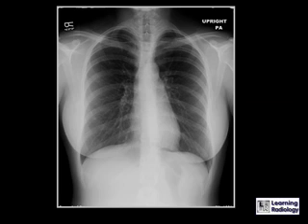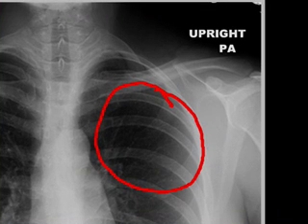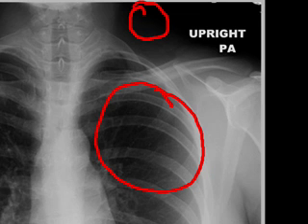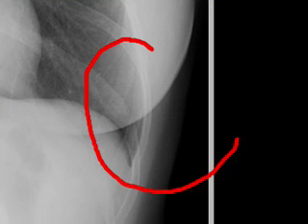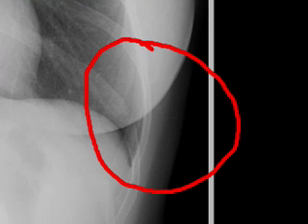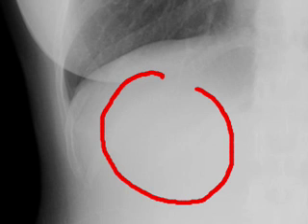How this works in everyday practice is shown on this frontal chest radiograph. We can see air density here in the left upper lobe of the lung. We can also see air density in the room surrounding the patient. We can see fat density in the chest wall. We can see fluid or soft tissue density in the right upper quadrant of the abdomen with the liver.